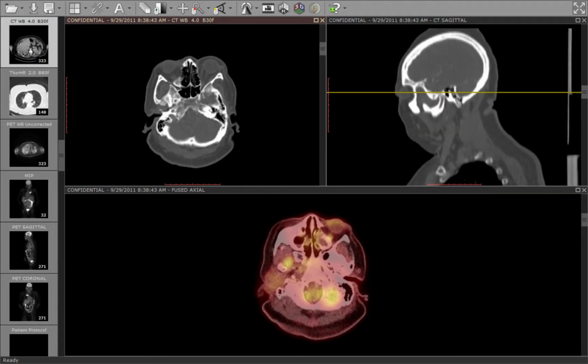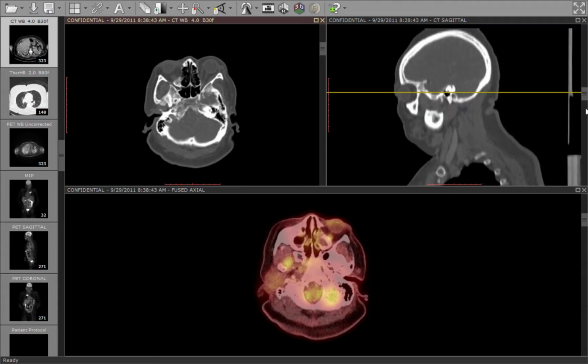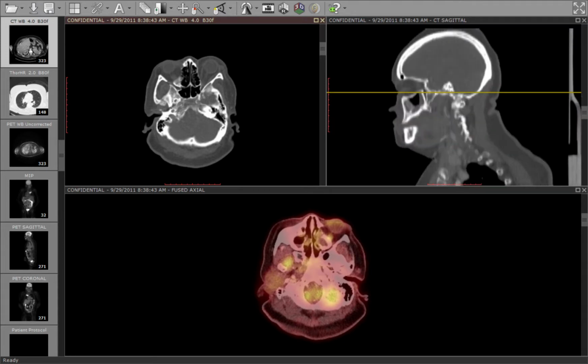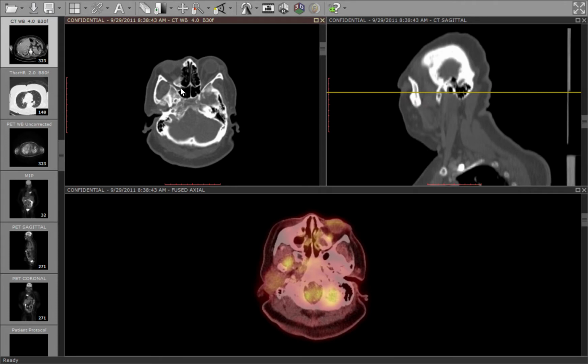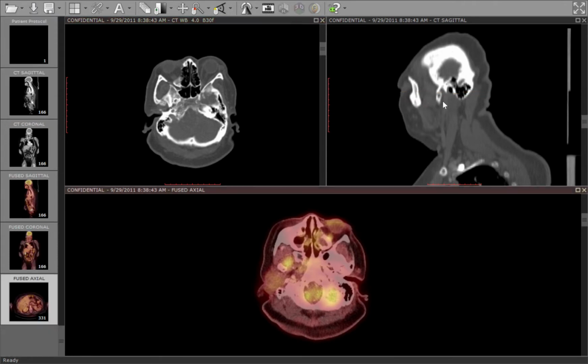So in the upper right hand portion of the screen, there is the normal left condyle. Let me see if I can scroll over to the other side. Let me click off of that so you can see it. And here is the patient's right side. So you can see that condyle is anterior and translated down the articular eminence here. Let me show you the articular eminence in a little better detail.